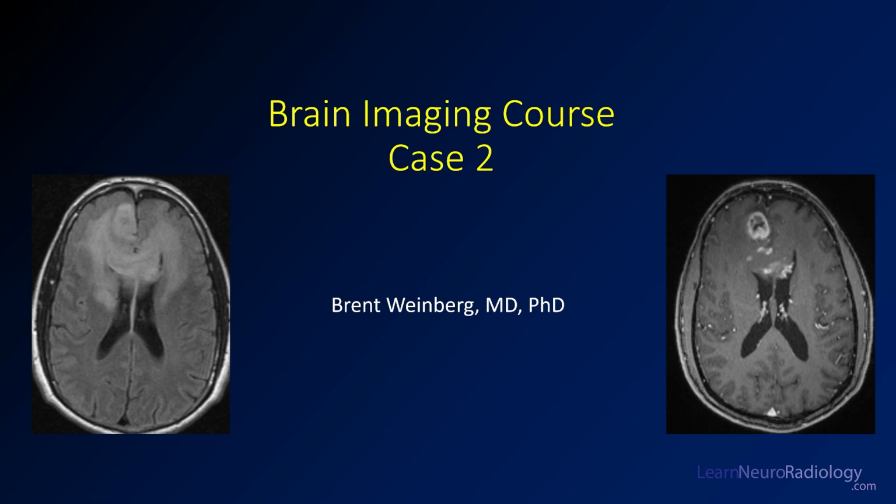I'm Brent Weinberg. Today we're going to be doing case 2 of the brain imaging capstone course. We're going to be going through some interactive images together and going through the explanation together. So be sure to follow along and let's jump right in.